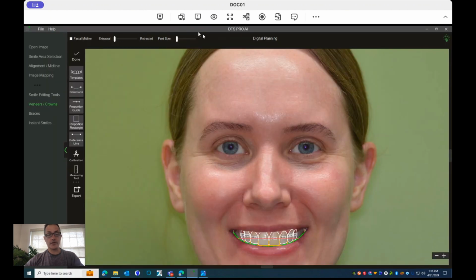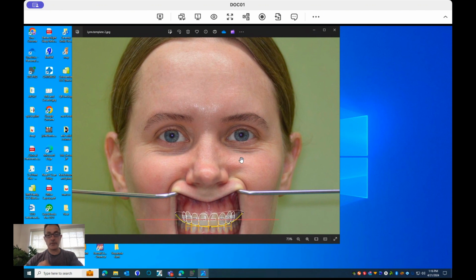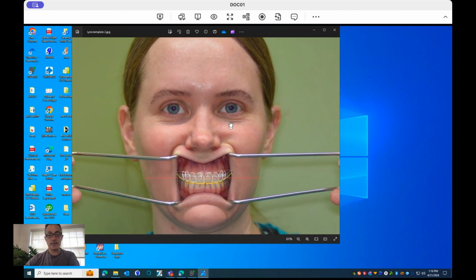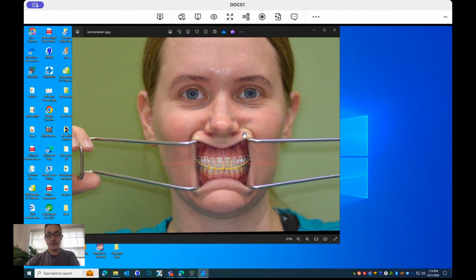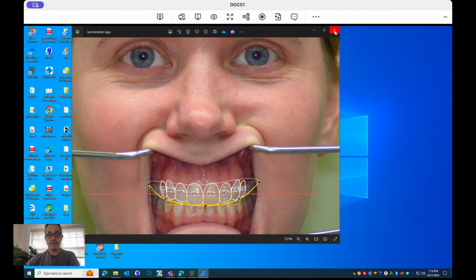I'm going to save that as Template 2. Whatever you want to name it is fine. And then we're going to open it back up. And this is what the lab is going to see.